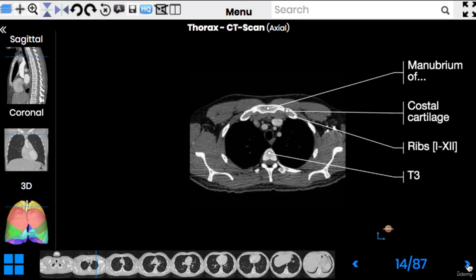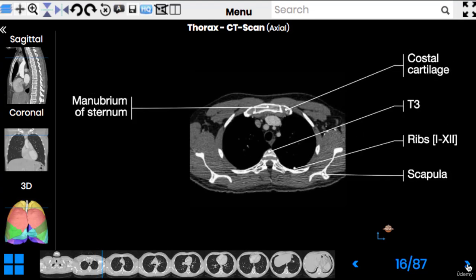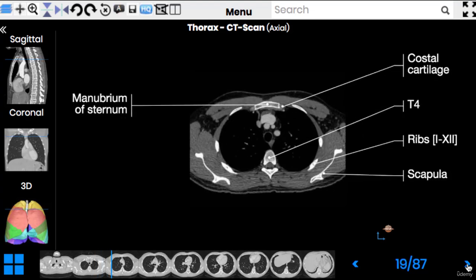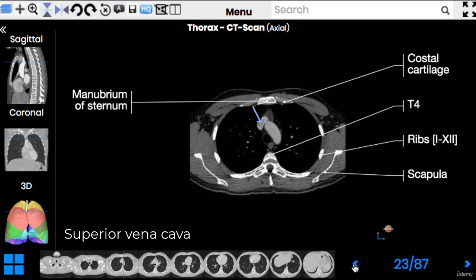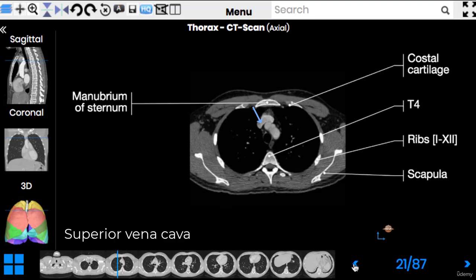They are slightly different. You see on the left, I see the oval-shaped shadow. This is because our left brachiocephalic vein lies more horizontally than the right brachiocephalic vein, which takes an absolutely vertical course. And as I follow them, you see how they converge, creating the superior vena cava right here.